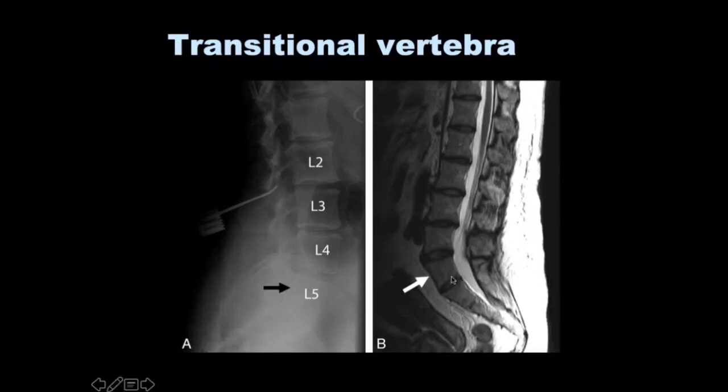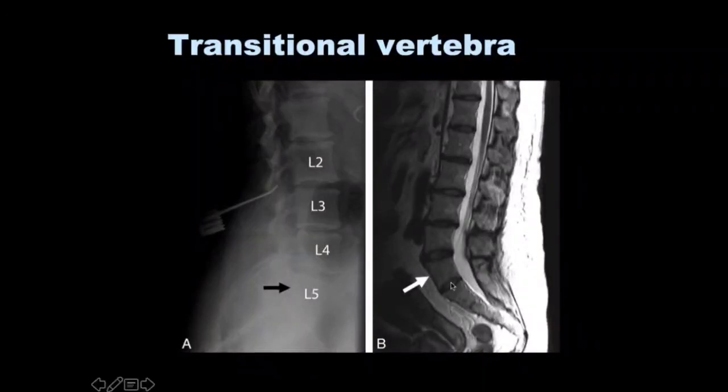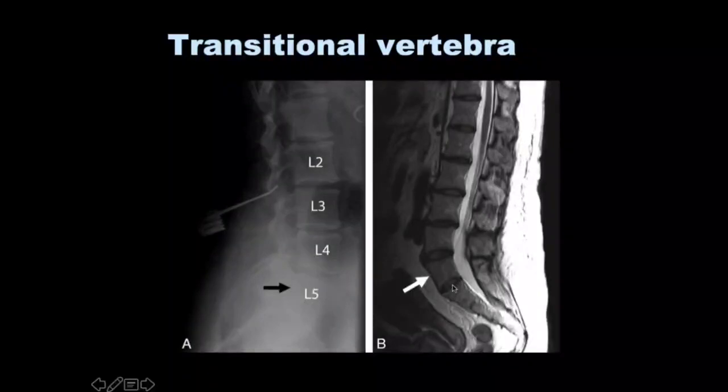So the way we phrase it is that if you think that this is the L5 vertebra, you'd say that this is a transitional segment, and for reporting purposes, there is a residual disc seen at the L5-S1, and so the other nerves which are getting pinched are at a particular level. If you want to be a purist and say whether this is a lumbarized or sacralized vertebra, you need to image the whole spine and then calculate it from the C1 vertebra and count the number down. So, something to be aware of.